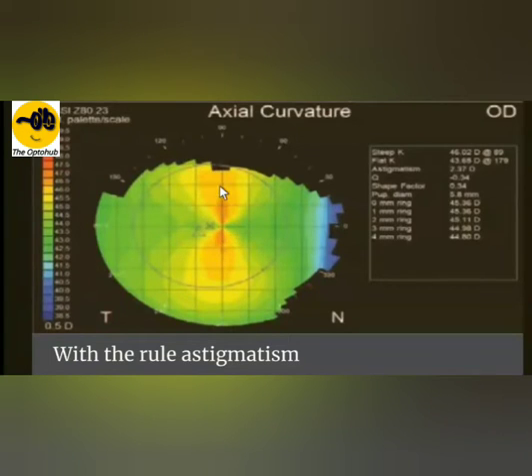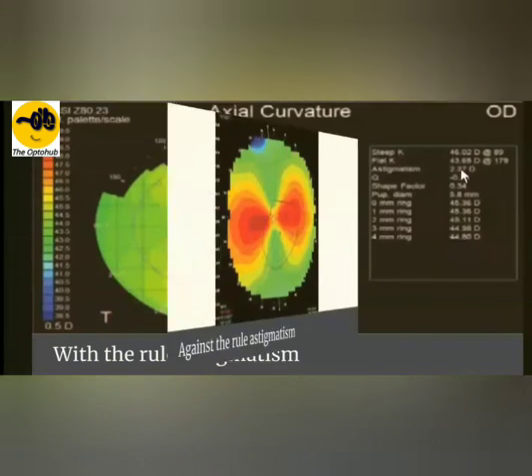So this is a vertical dumbbell, and it's a symmetrical dumbbell or symmetrical bow tie. On the right side you can see the measurements in the different rings, as well as the q value, that is -0.34. Now most of the things are falling into the normal ranges.